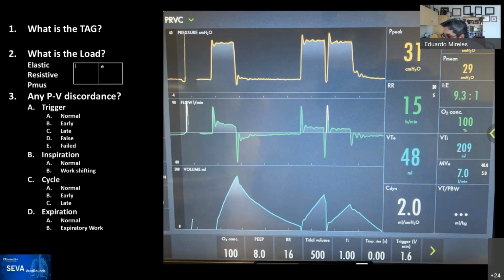Dr. Morales, can you hear me? This is Samid. Of course I can hear you, Samid. Go for it. Okay, so semi-cheatingly, the control variable appears to be pressure. I can see that the pressure waveform appears to be controlled now. I see breath one. I'm assuming there's a flow trigger because it's a servo vent, and I can see some color changes. The first breath is machine triggered, machine cycled. Then there's a machine triggered, machine cycled breath followed by a patient triggered breath. So I would call it PCCMV.